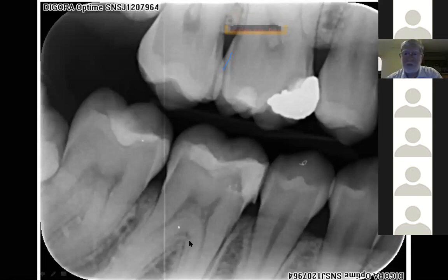Okay, so is there caries anyway? One six and secondary caries. Okay, so 1-6 and 4-6. So we're talking about this area here. We're talking about that area there. When we're talking about this area there, please keep that little line in mind. Okay, when we go forward.